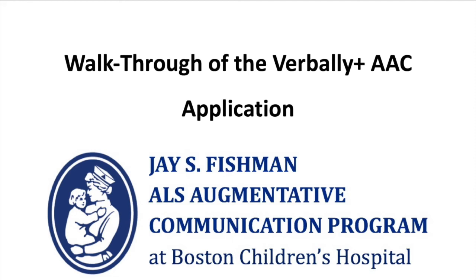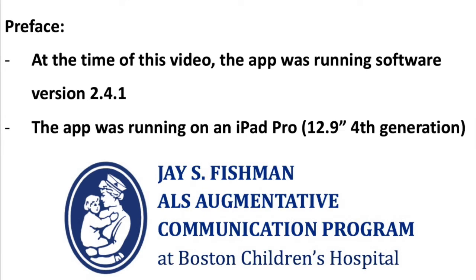This video will provide a walkthrough of the Verbally Plus AAC application. It's important to note that at the time of this video, the Verbally Plus app was running software version 2.4.1 and running on an iPad Pro 4th generation.